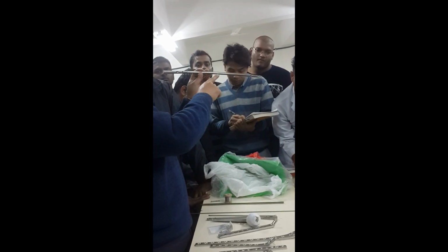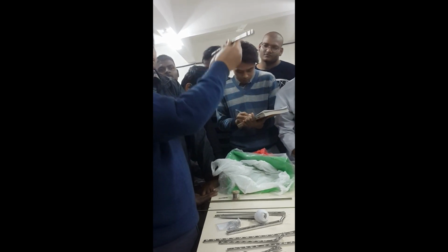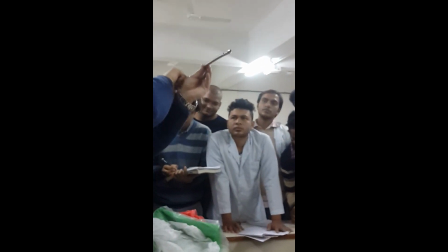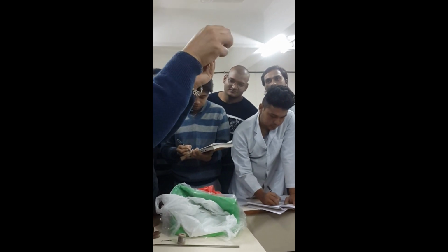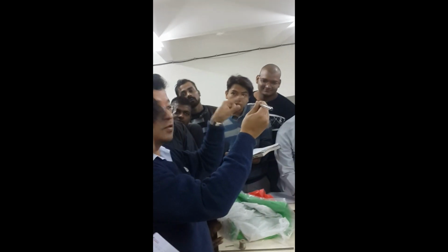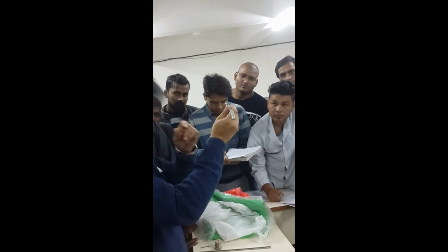If you look at the holes, spherical, spherical, spherical, oval. The spherical holes are for static locking. You put a screw and it just locks, there's no movement. But the oval hole has space for movement, so that is for dynamic, and this is for static.